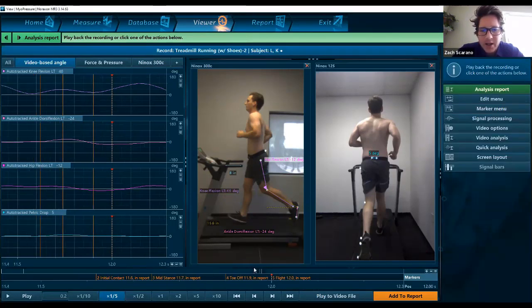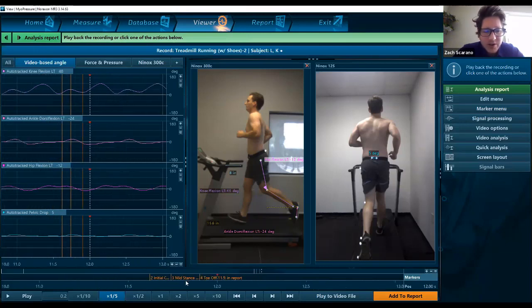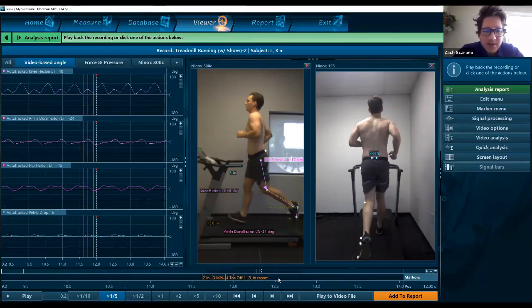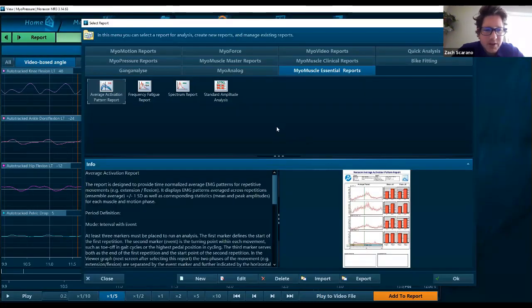But regardless, this is once you have those laid down for a couple of the different points of interest that you'd like, and of course you can use as many of them as you want. You can then run that report, and so we'll go ahead and look at an example of that real quick, and then I'll show you a couple other reports that do a little bit more of an automatic tracking using some point of interest options.